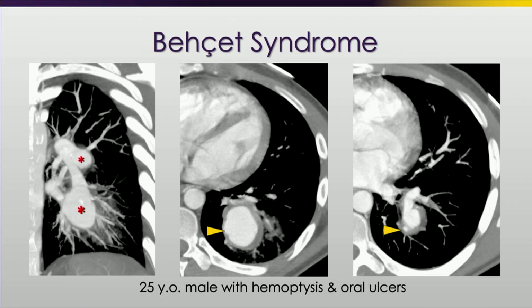As part of his workup, a CTA was performed to rule out PE. You can see these images, which are coned to the left chest, that he has multiple pulmonary artery aneurysms, and that I've shown with yellow arrowheads that there may even be some erosive changes in the wall of the largest aneurysm centered in the left lower lobe.